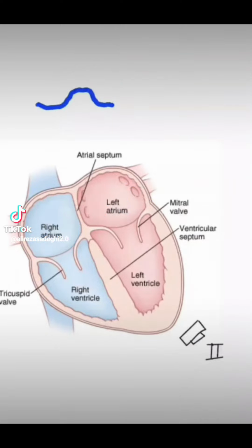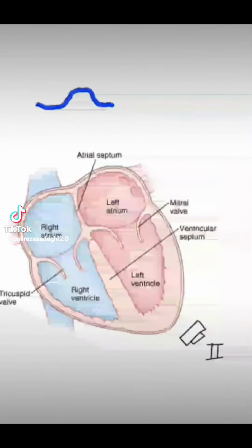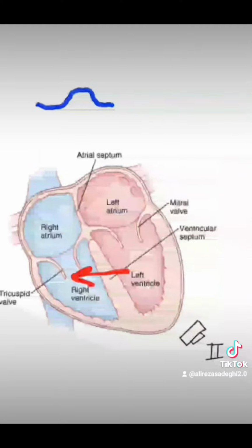The intraventricular septal fascicle is responsible for depolarizing the intraventricular septum. This depolarization occurs from left to right and away from lead 2. This depolarization is represented on the ECG paper as the very first negative deflection following the PR segment. We call this the Q wave.